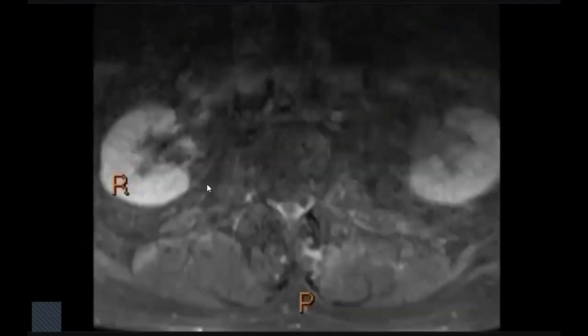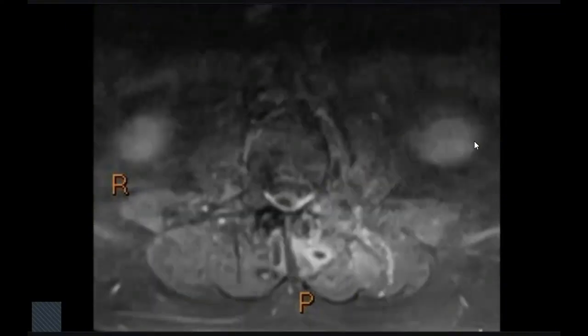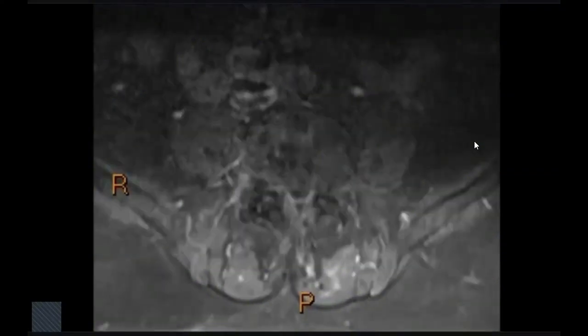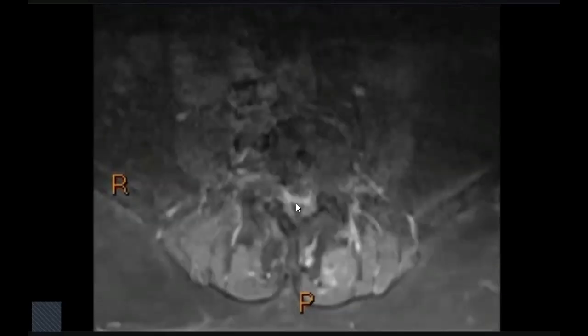Here's the axial T1 post-contrast. Right, so these are axial T1 fat-sat post-contrast images. I can see that there are clumped nerves in the cauda equina. Can you show me the clump? Yeah, it's this region, for example.